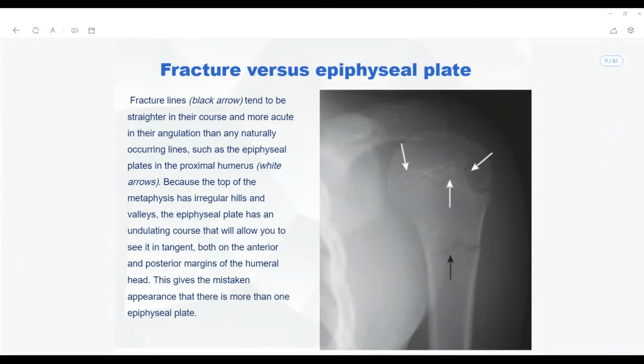So you understand why I told you the rules of observation yesterday. This one is about the classification of epiphyseal plates and the classification of fractures. So Benedict, is this point clear now? How can you differentiate between the epiphyseal plates and the fractures?